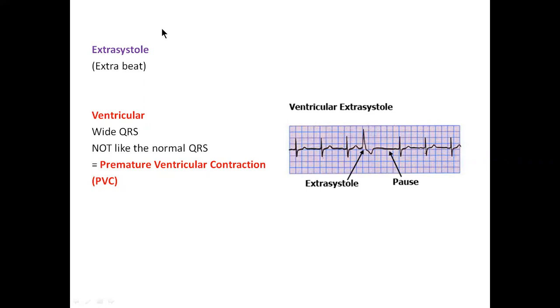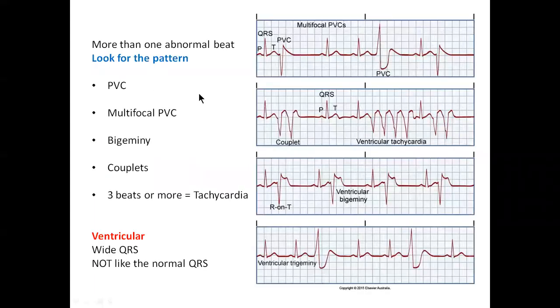And the other is one other word, extrasystole. It's self-explanatory. It basically means extra beat. Now let's dig in deeper. Let's look at all kinds of ventricular beats and different names. So the first one is premature ventricular contraction or PVC.